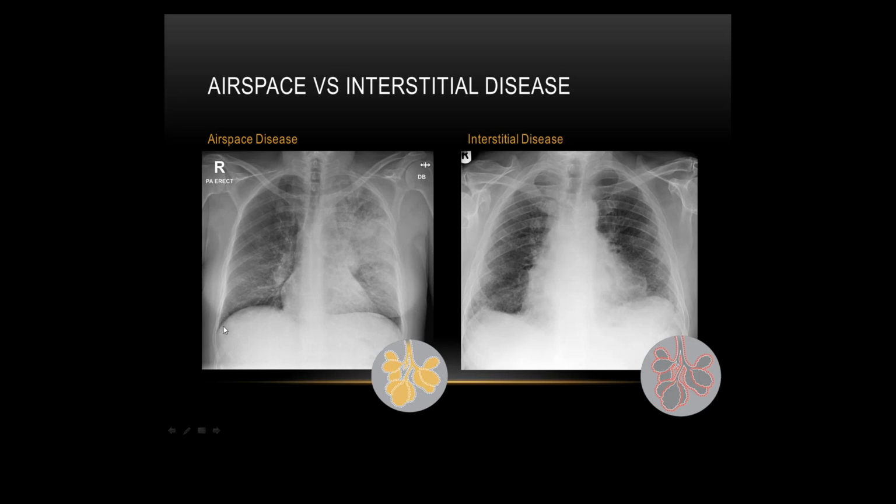Sometimes you can have pleural effusions associated with it, so you have parapneumonic effusions and empyema. If you're looking for an empyema, you might see a loculated pleural effusion. I haven't touched upon pleural effusions as much in this presentation, but in a nutshell, a standard pleural effusion will tend to accumulate in the bases. If you've got a complex or loculated pleural effusion, you might see it adhering to the wall here because it's become a bit sticky, so it'll stick to the side of the wall, and you may not necessarily see anything in the lung bases.